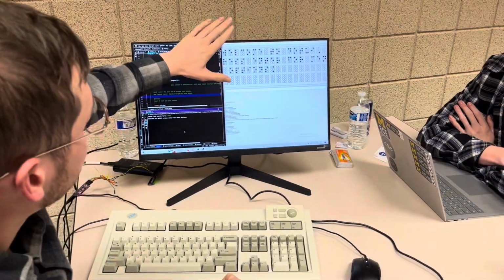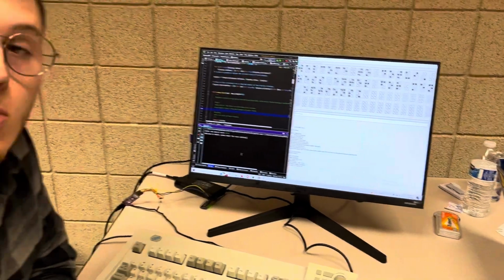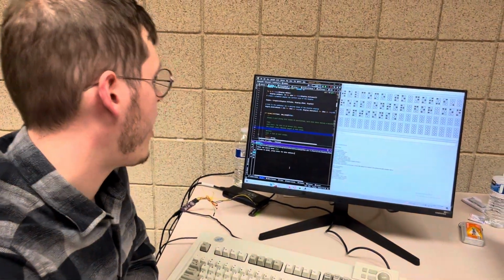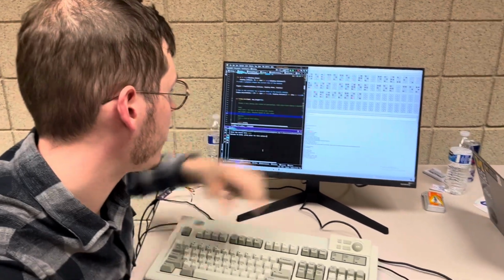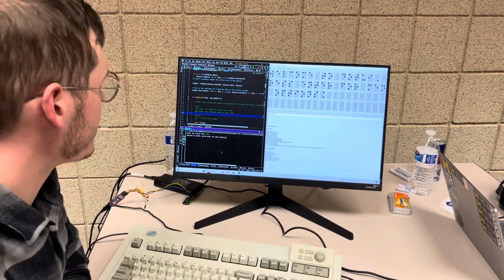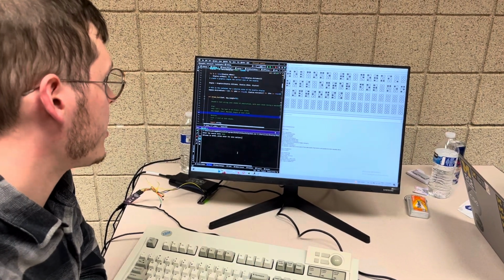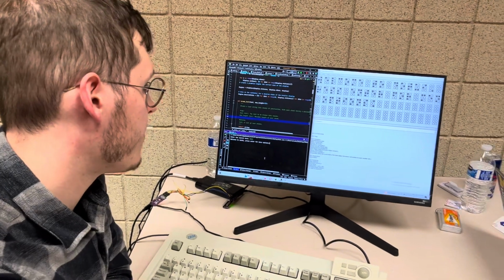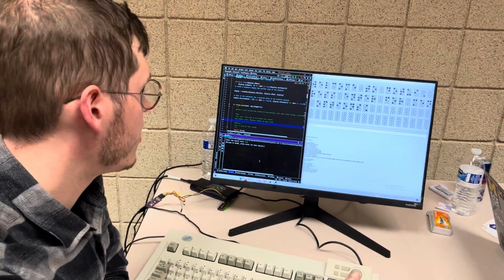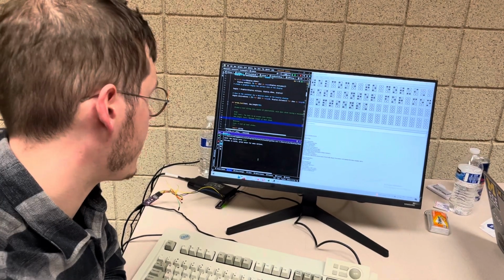So this right here is our HAP main window, and what this is, is a digital twin of a multi-line braille display. And our program over here is our user interface that's interacting with our multi-line braille display. What it does is it opens up the possibility for the blind community to use their multi-line braille display to access ChatGPT, Wikipedia, and PDF files, as well as interpret images based on the vision tool inside of the OpenAI API.